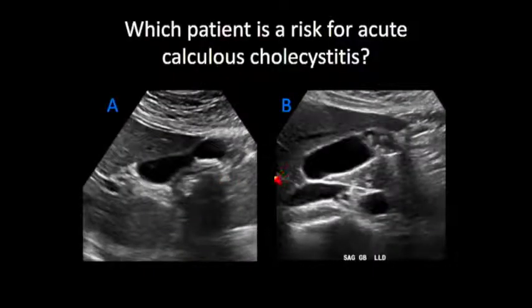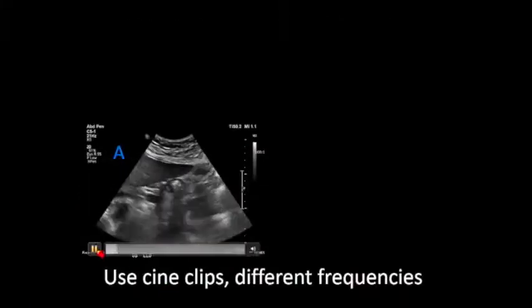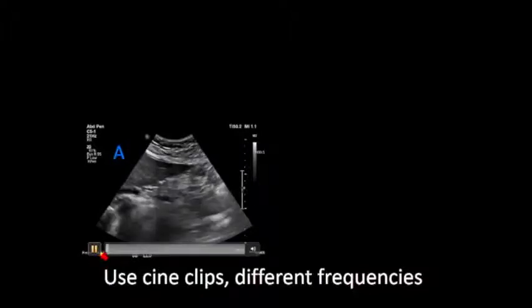Okay, now you get a choice. Patient A, patient B. Two different gallbladders. This gallbladder has some bright stuff with shadowing. It looks like stones up here at the fundus. And this patient has bright things with some shadowing up at the fundus. Which of these patients is at risk for acute cholecystitis? So, patient A, okay. Those are truly calculi up in the fundus, and they could fall out.